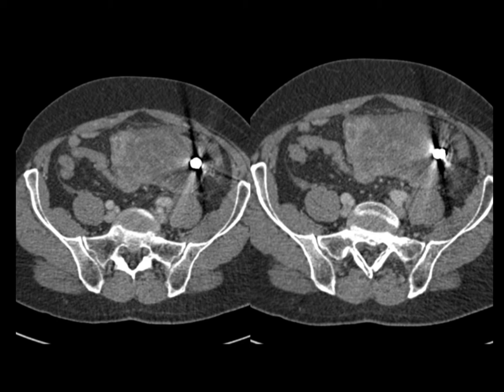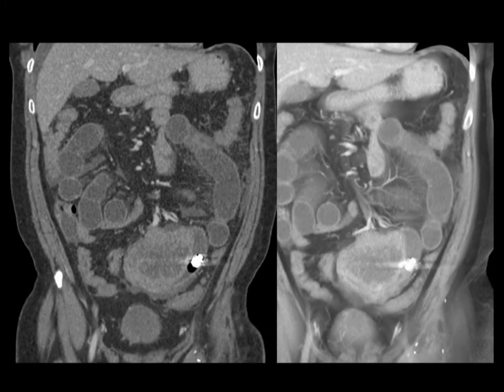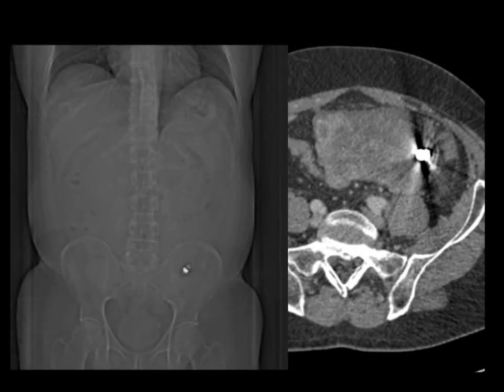Many people recommend CT first, and if you see obstruction, you can't give a capsule. But here, you have a capsule. There's only one way for the capsule to come out, and that's going to be by surgery. Just something you don't want to do. And here's a picture of the capsule, and there it is. Looks like a Sputnik if you look at the patient's topogram.